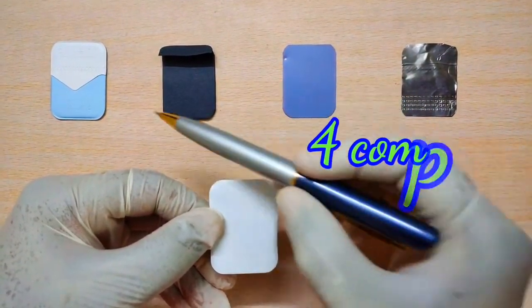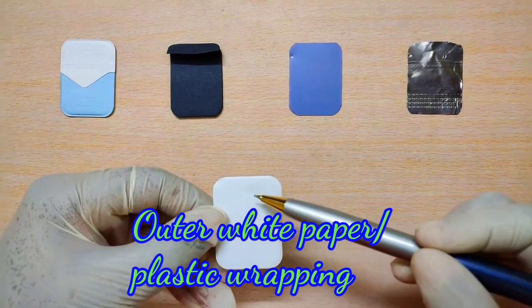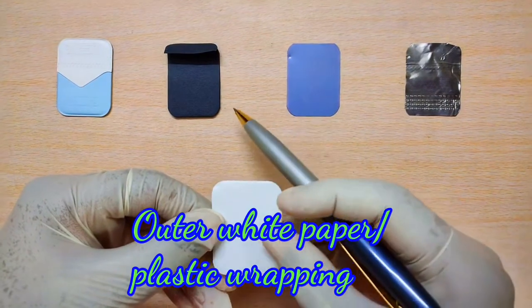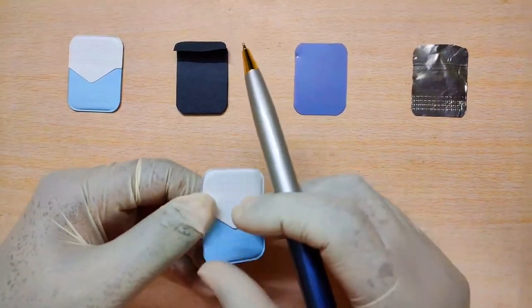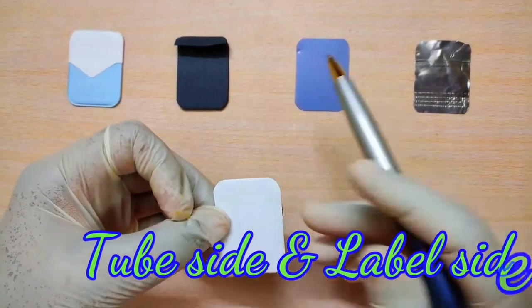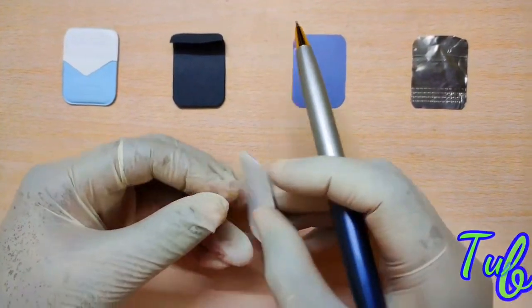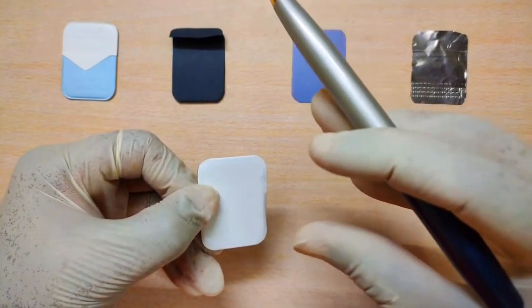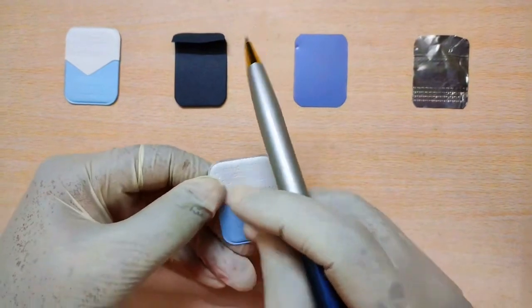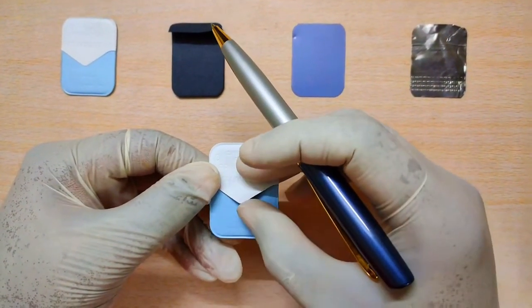The first component is the wrapping which you see from outside. It is the outer white paper or plastic wrapping which is made up of soft vinyl or a paper material, and a film packet has two sides. They are the tube side and the label side. This tube side, which is completely white here, should always be facing the X-ray tube, and the other side is called the label side, which is the back side of the film and from where you can open the film packet during its processing.